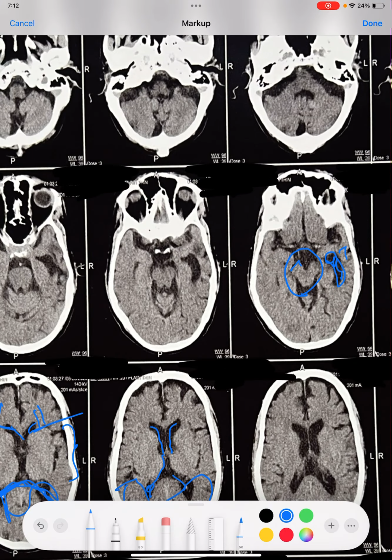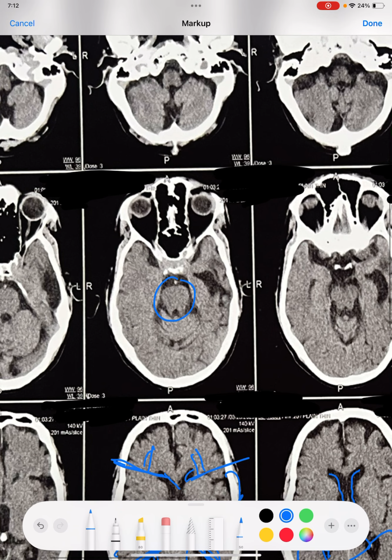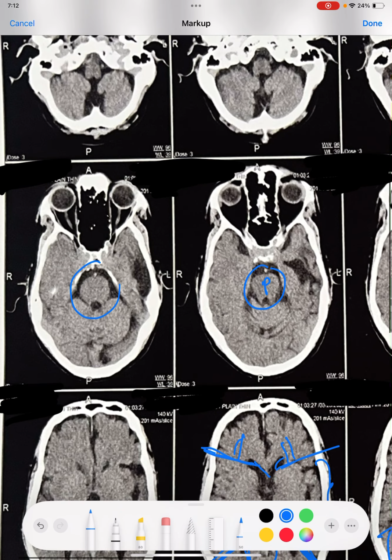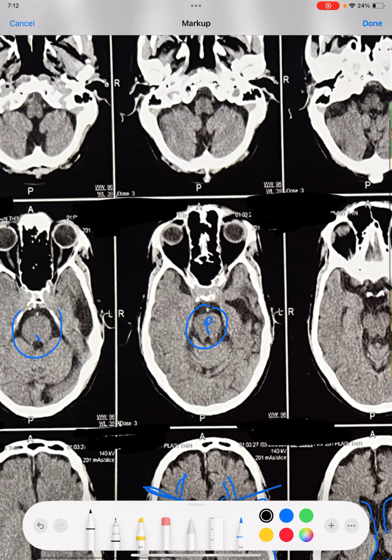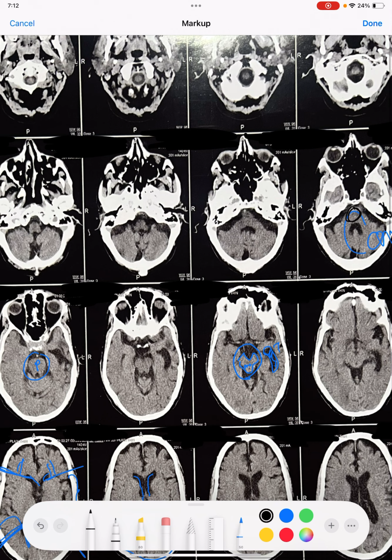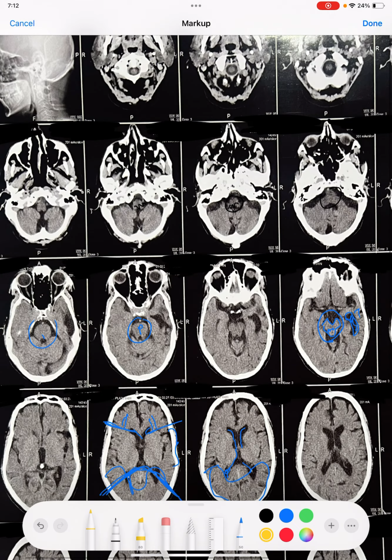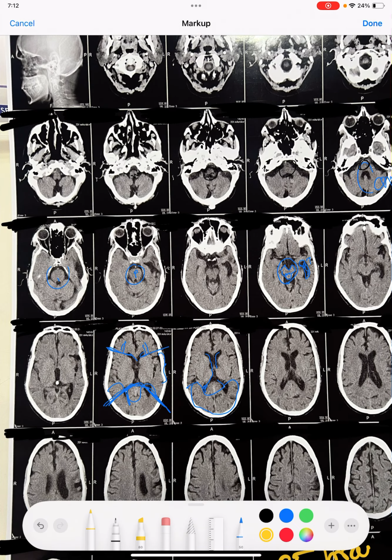This is butterfly shaped. This is the midbrain, and the perfect circle below this is the pons. This is the pontine artery, which is in the middle and which we can make out very nicely. Below that is all pons, and below this is the medulla.